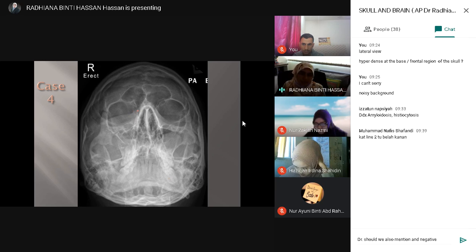And then what your friend noticed, a bit of opacity, yes, there is opacity here. So correct, subcutaneous or soft tissue swelling because of the fracture here. So that's why whenever you see some findings, you have to dig and dig and dig. So just like before, you already saw something is not normal, you should explore more at the region of abnormality. So train your eyes and your brain that way. So you already see abnormality, don't stop there. You have to dig more and more. What is abnormal? What is abnormal?